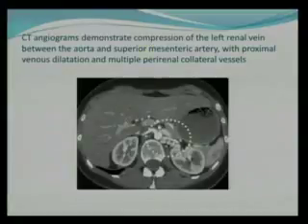And what are these, John? Have you had a CT rotation? Okay, Daniel, you? That's a dilated canal. Yes, these are tributaries of the gonadal vein. Very good. So these are the tributaries of the gonadal veins which are backing up. The more you go down towards the pelvis, you might see 3, 4, 5, 10, 20 venous channels. That just depends on how much collateral network there is of the gonadal vein.